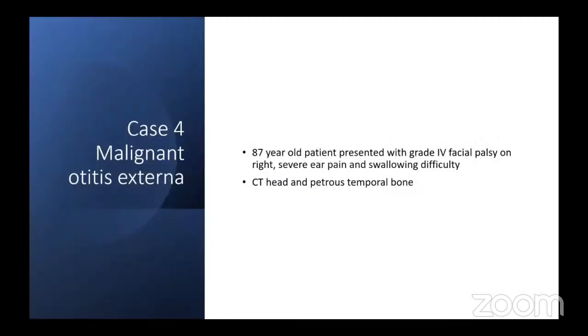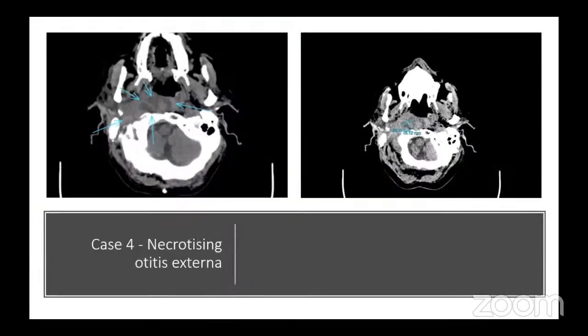Next case, skull-base osteomyelitis. 87-year-old patient presented to ENT with significant ear pain and multiple cranial nerve palsies, grade 4 cranial nerve palsy, and swallowing difficulty. He went on to have CT head, which showed necrotic focus in the petrous apex area.